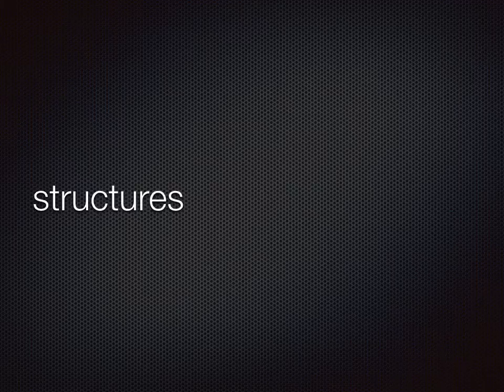Okay, we're going to look at the structures seen in the views in a little bit more detail, because that will help you understand exactly what you're looking at. Okay, let's have a look at the structures in a little bit more detail. I want you to really look at the images a bit more closely to fully understand what the normal heart structure and function looks like.